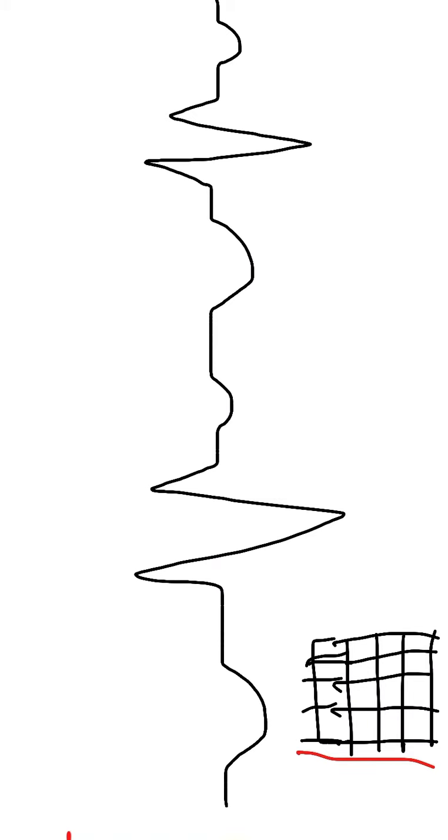So if you calculate, it means that one of these small boxes, which are about 5 by 5 in a large box, will take about 0.04 to pass through the pointer. Now, in order for you to know how much time it takes for a wave or a segment or an interval to go through the pointer, all you have to do is see how many of the small boxes were covered and multiply that by 0.04.